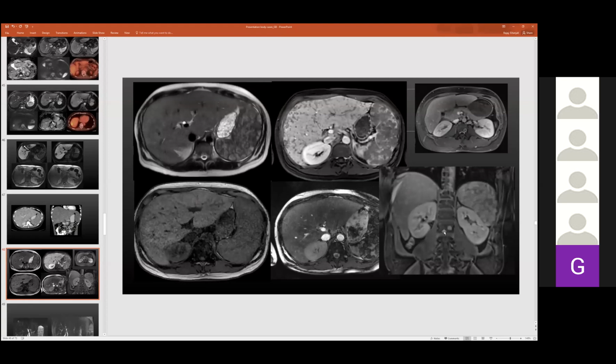a bone lesion. So in a young patient, if they have these multiple small lesions in both liver and spleen, obviously sarcoid becomes the topmost differential. But surprisingly, the bone lesion was picked up on a second follow-up MRI, and he actually presented with abnormal LFTs. He didn't have any symptoms of sarcoid, so a CT chest was not performed.